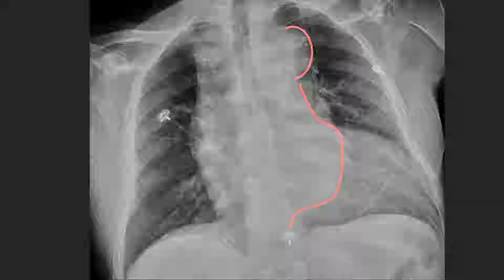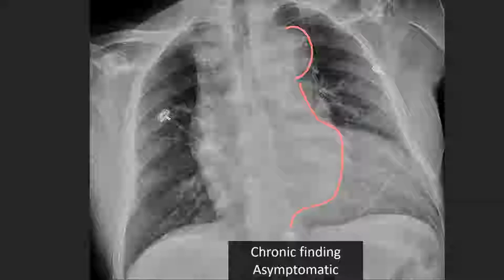Clinical history and comparison x-rays are quite important in this scenario. Should the patient have no priors or be presenting with acute chest pain, particularly if radiating to the back, a CTA of the chest should be considered to assess for dissection. This patient had prior chest x-rays that showed this to be a stable finding and was currently asymptomatic.